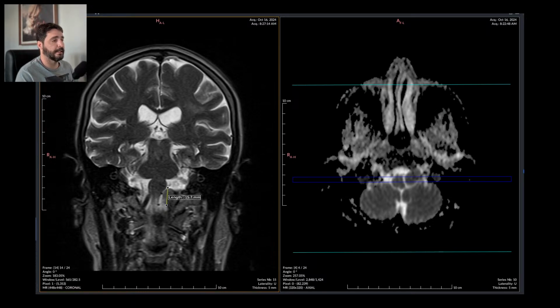Also, this patient has a lumbar spine scan, which is kind of ugly, but we are going to finish up the brain scan first, because first things come first. We are probably going to miss anything if we just jump to the lumbar spine before reporting this. So Fazekas 1 is right here.